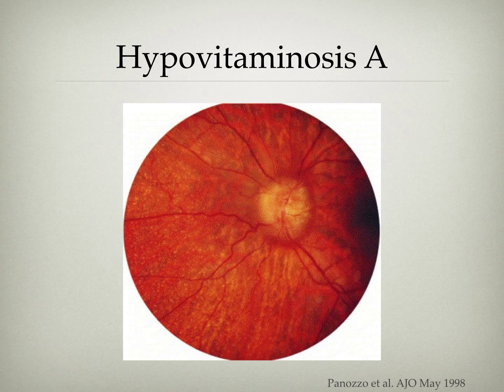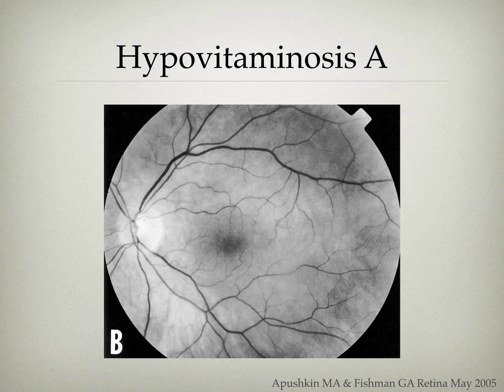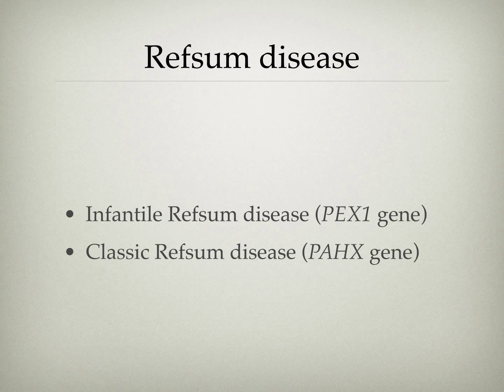These are those little dots. I searched all over for a good picture. There's probably some good pictures out there that I couldn't find. A few more of those little dots. And those go away with treatment. So we'll stop there and talk about some patients.